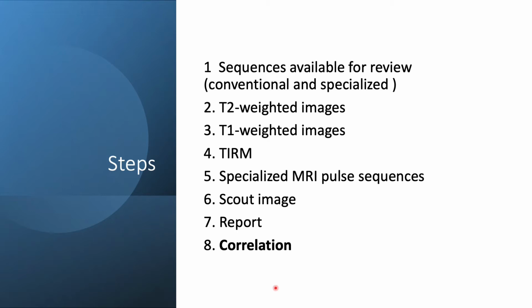And the most important, I look at the report, whether I've missed something. The radiologist can actually report various coincidental findings like thyroid nodules or sometimes even uterine fibroid, which the report usually mentions. And then the most important step, which is the 8th step of this, is actually how you correlate with the clinical findings of this patient.